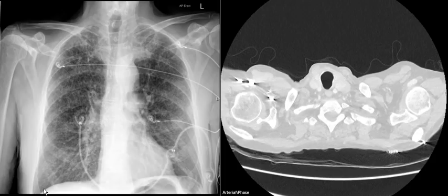So if you're getting towards where the diaphragm is, in terms of vertebra, it's about T11, T12. So that would be too many, and he's hyperinflated, and they look kind of flattish. The lung fields themselves look reasonably black, but bits of them might be too black and white, and some of these changes look to me structural, like they look like holes and walls and voids, which when you've seen a few of these start to make sense. There might be a slight haziness in the right lower zone.